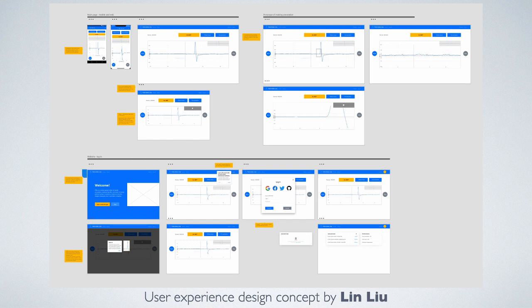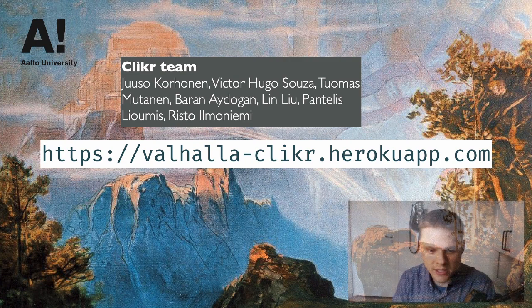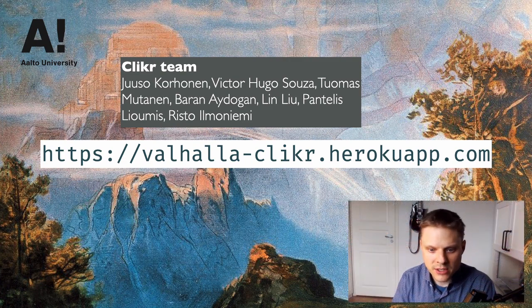I suggest that you go and take a look at the system online and consider contributing to the analysis of the database. If you'd like to contribute to the annotation of the data, you can go to the platform and start clicking. However, if you would also like to receive acknowledgement for your work, you need to create a user account in the system so we can track your progress. The user interface is still a work in progress and we'd appreciate any feedback you can provide.